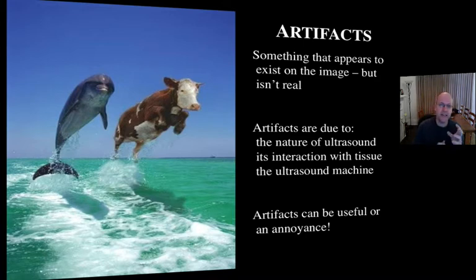Now, artifacts can be really useful in ultrasound. They can help us see things or interpret things in a special way to make diagnoses. But they can also be really annoying because they can hinder and degrade the image.